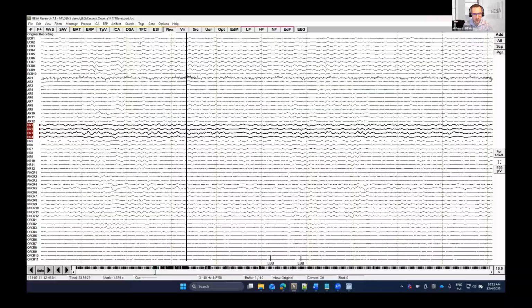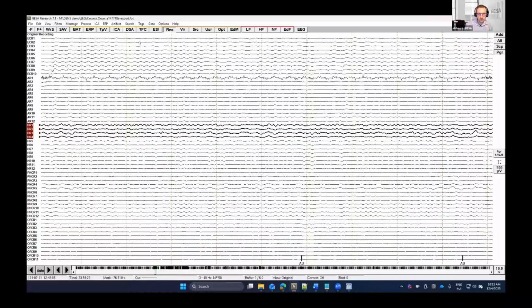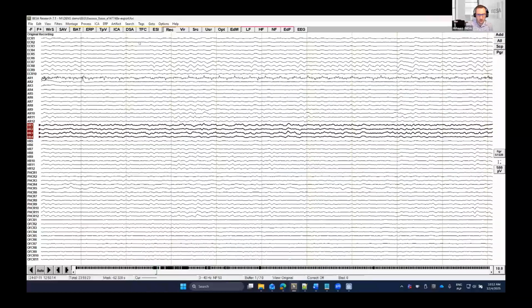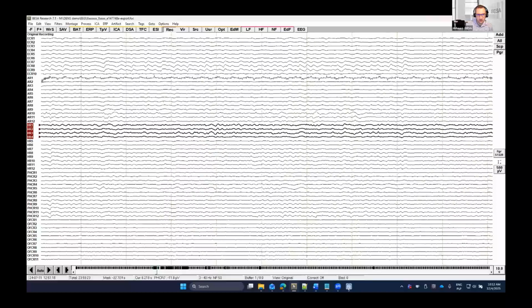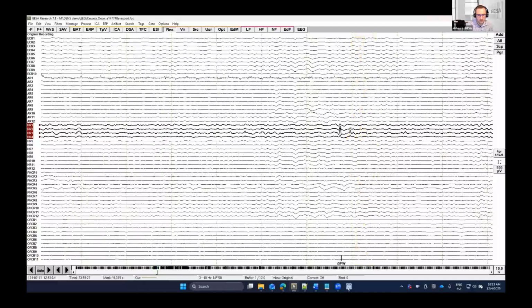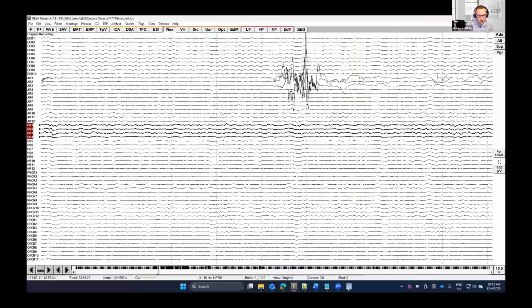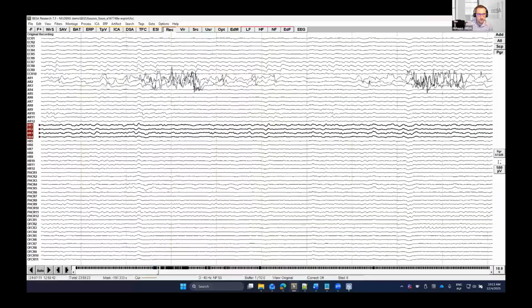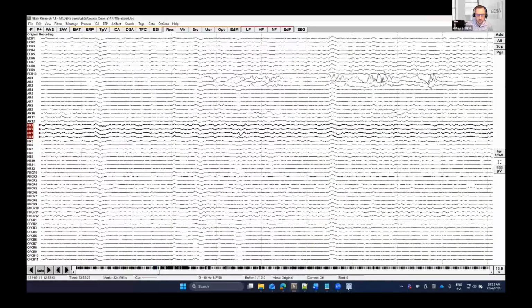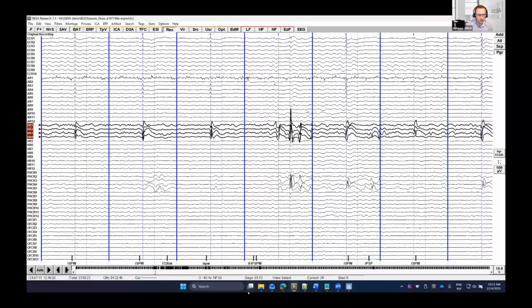And we just wait for a second while it goes through the data and looks for the spikes. We can see how it works. It finds already a few spikes. Halfway there. We found the markers. We found some spikes.